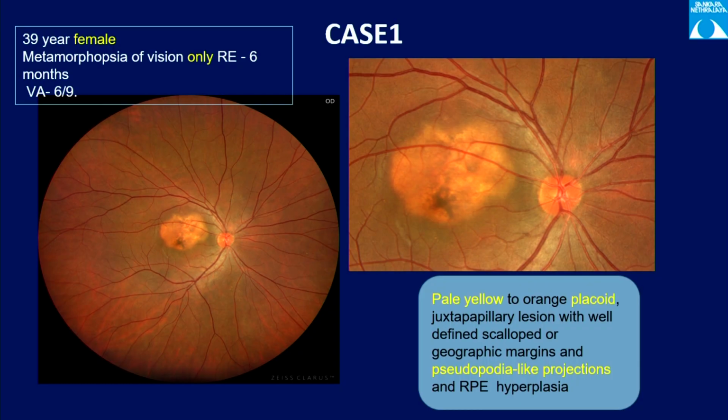So now in this particular fundus image, you are seeing a hypopigmented lesion or an amelanotic lesion, if you would like to call that, and the location. So where is the site of the lesion? Because sometimes these things do give you a clue as to the peripapillary location or within the posterior pole. How does the margin appear?